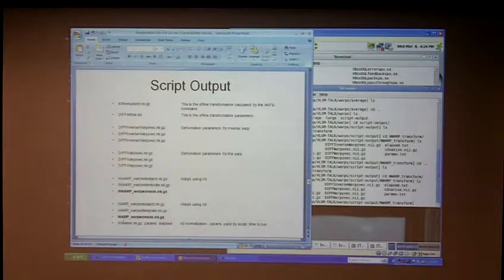And you're talking about diagnostics, right? About figuring out what went wrong. Yeah, I'm going to talk a little bit about it. I think it's one of the hardest parts of this whole process, how to decide when a warp goes wrong and why. Other outputs that it spits out are the N3 normalization parameters that were used within the script. So let's say you change the defaults, the params file would list what parameters were used for that specific warp, and then elapsed is just how long it took to run.